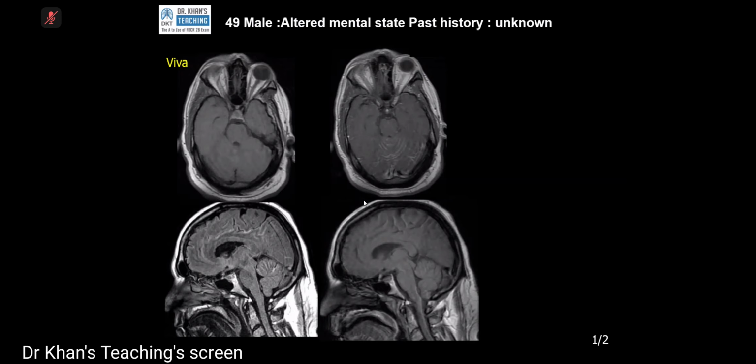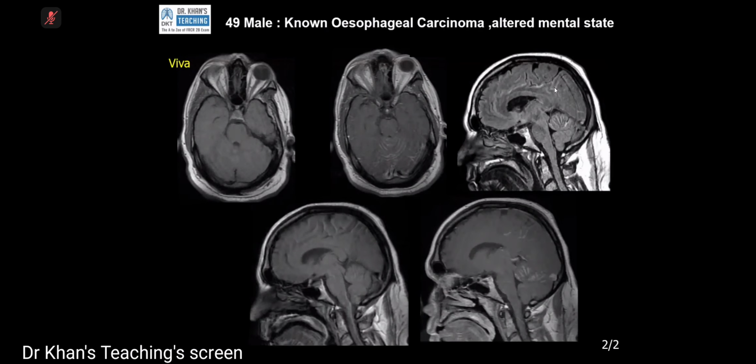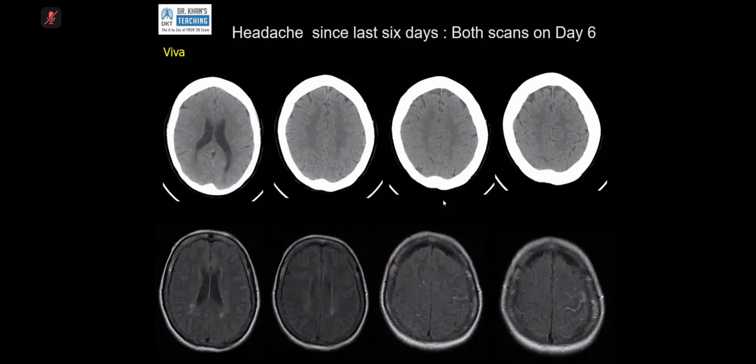If it enhances, it is a different scenario. If it does not enhance, it's a different scenario. Why? Because in this particular case, this is the FLAIR, and then we gave contrast and these foliar structures enhance. So this is a leptomeningeal carcinomatosis in a case of esophageal carcinoma.